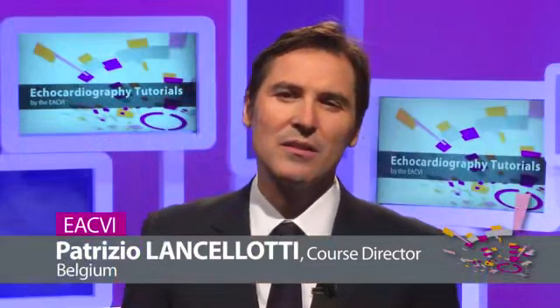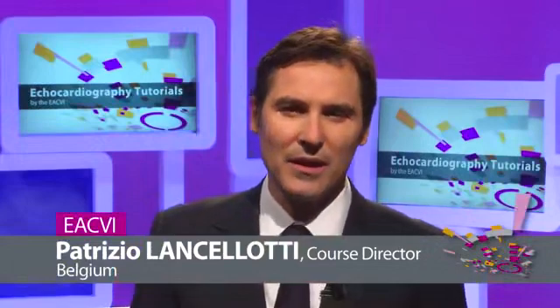Infective endocarditis represents a serious and dramatic condition that should be diagnosed promptly. So Gilbert Habib will summarize the main echocardiographic features to be examined in patients with suspected infective endocarditis. He will first focus on the assessment of the anatomical changes suggestive of infective endocarditis, like vegetation, destruction of valve, and abscess. Afterwards, he will examine the hemodynamic consequences and the complications associated with the disease.